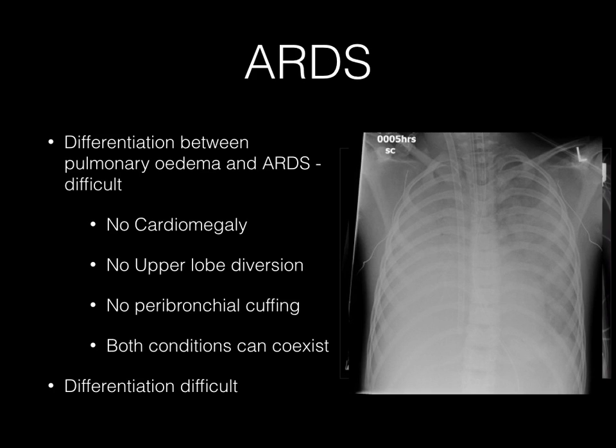More likely to be non-cardiogenic pulmonary edema, based on the fact that the patient looks like he's on an ECMO circuit. Then we can give a differential diagnosis for a non-cardiogenic pulmonary edema, including infections such as bacterial, fungal, viral. It could be drowning, fluid overload, inhalational injuries, ARDS patterns, or even pulmonary hemorrhage in hematological patients.